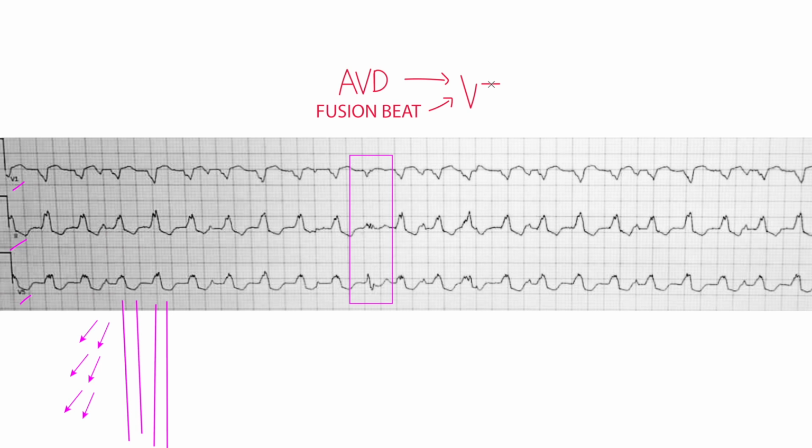Now again, looking at this just looks like a bundle branch block, but where's your atrial activity? Speaking of atrial activity, we were looking at these little blimps here, and if you compare these blimps to other channels, that little blimp is present in other channels as well. So this indeed is real. Okay, that's one. Here's another one. See that? So this is real.